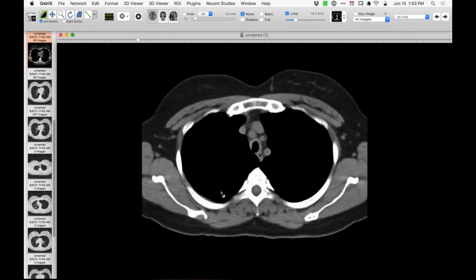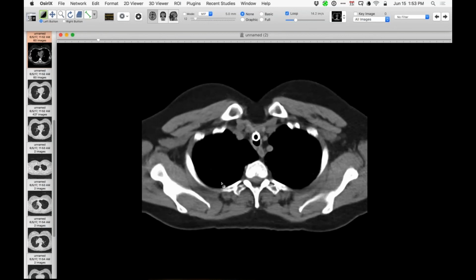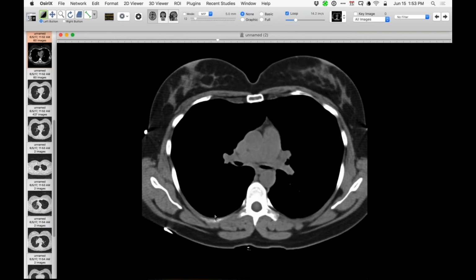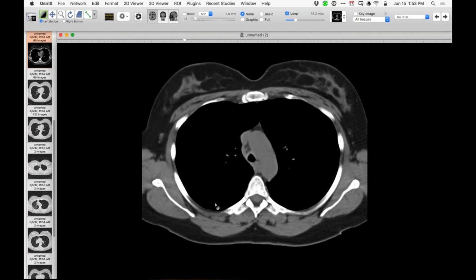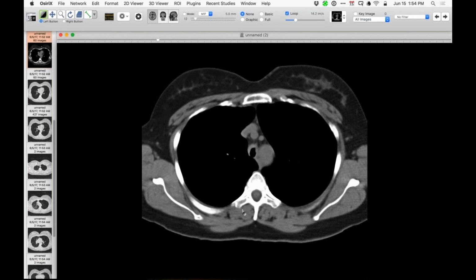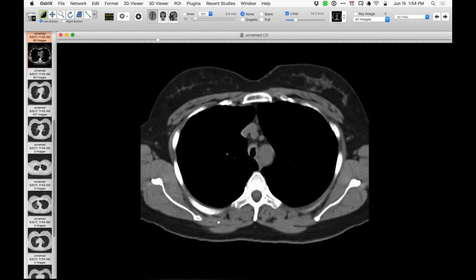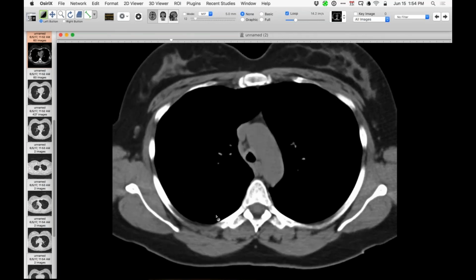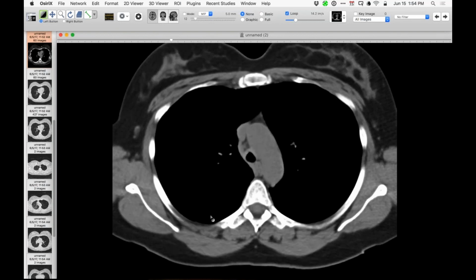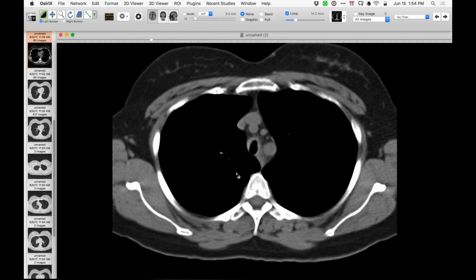So we raised the possibility of relapsing polychondritis as the actual cause of the tracheal narrowing. I don't know if the diagnosis was made before, and then subsequent clinical notes have mentioned relapsing polychondritis. So I think it is probably going to be a case of relapsing polychondritis in this person as the etiology for that. I think she has sinus disease. I don't think she has ear disease, but certainly from the point of view of imaging, this is very consistent with the pattern of tracheal narrowing from relapsing polychondritis as the etiology in this person. So I thought I'd show that. Nice demonstration of the posterior membrane sparing.